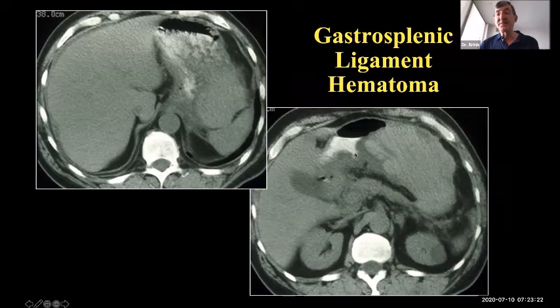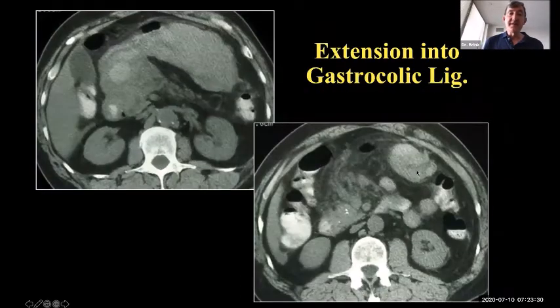and in fact, the ulcer may actually be right here coming off the posterior wall of the stomach, resulting in this large hematoma in the gastrosplenic ligament. And you can see it actually extending over immediately into the right abdomen in the probably gastrohepatic and hepatoduodenal ligaments as well. Interestingly, the gastrocolic ligament is here between stomach and colon, and you see some of the hematoma extending that direction.